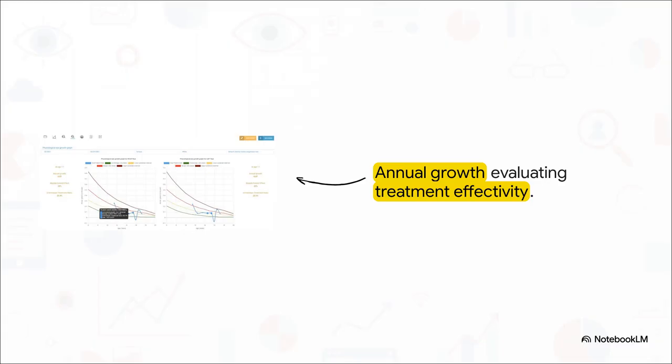And the software literally does all the heavy lifting for you here. It calculates and displays the treatment effectivity as a clear percentage. You get one metric compared to untreated myopia and another compared to that healthy physiological emmetropic growth ratio. Having these exact calculations right in front of you empowers you to confidently decide if a therapy is working beautifully or if, hey, maybe an adjustment to the treatment plan is necessary.